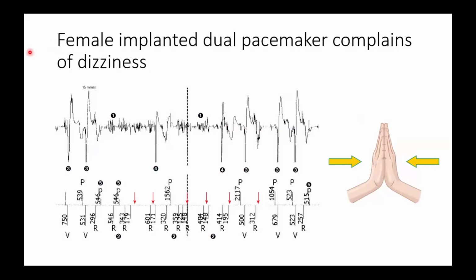This is the ventricular channel. Here, V means pacing. Okay.